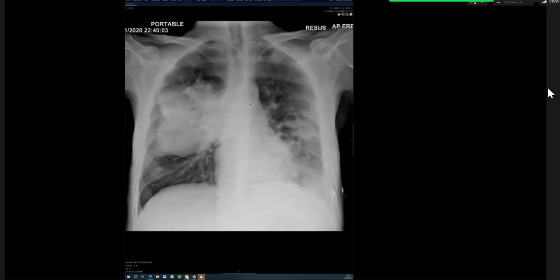So you have multiple lesions in both lungs. I need a differential and I need next steps. This may be multifocal pneumonia, may be metastatic in nature, but I need to review the history of the patient and approach the referring physician for further CT for more evaluation.